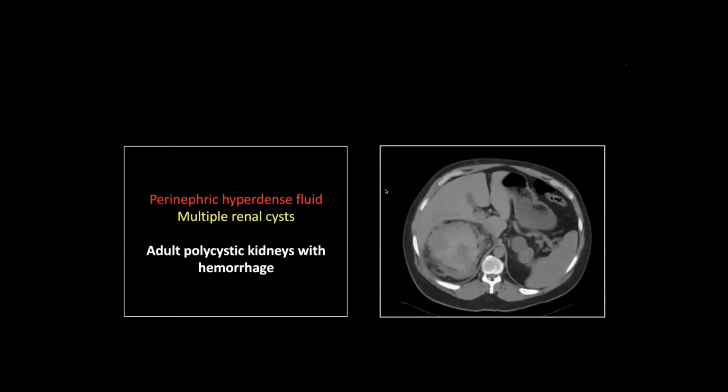So you'll see a lot of polycystic kidneys, but you don't see them hemorrhage all that often. Certainly they can hemorrhage, they can be superinfected, and ultimately there is no significant increase in renal cell carcinomas or other tumors with polycystic kidney. That's a little bit under debate, but if there is a predisposition, it is not great. But I'll tell you one thing, these things do complicate the search for tumors, right? When you MR these, they can have blood products in all stages and be a bizarre mix of hyperintensity and hypointensity.